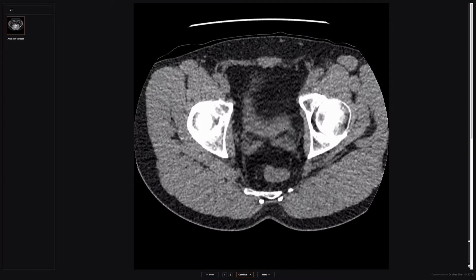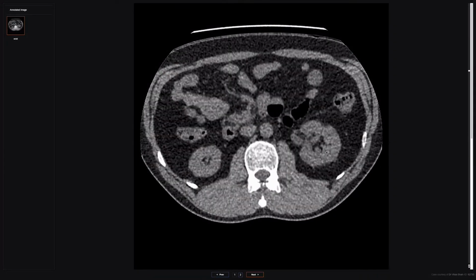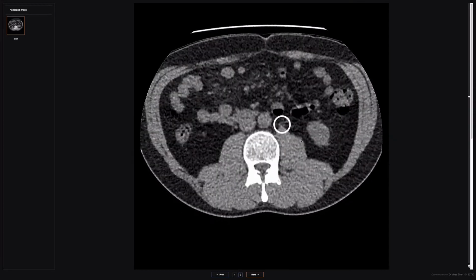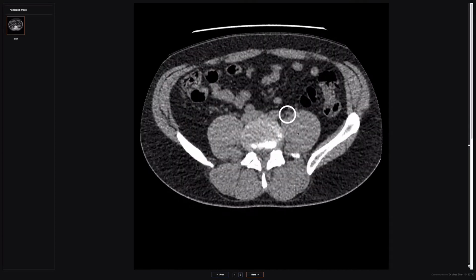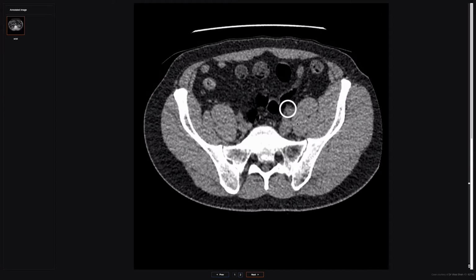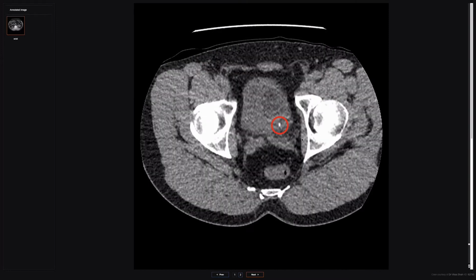That patient's left-sided colic should resolve. So that history was consistent with the type of study they requested, and we go through and do a CT KUB, and it's the right test. Now I'll send you a link to this playlist afterwards that you can look at, but I also annotated the path of the ureter on here, because I think it's really important that you learn, when you're looking at these studies, what the normal path of the ureter is, because sometimes it can be very tricky to appreciate on a non-contrast CT, particularly when it's non-distended. So if you fix in your mind where you should be looking to follow the ureter, then it's quite useful when you're doing other studies where the ureter is not distended.